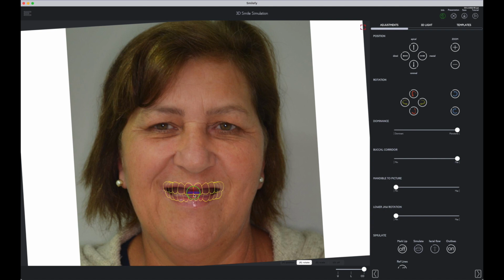The advantage of the 3D simulation is that the generated model can be rotated towards the facial orientation. The 2D limitations are solved. The 3D simulation result is accurate and can be used in the 3D design and planning.